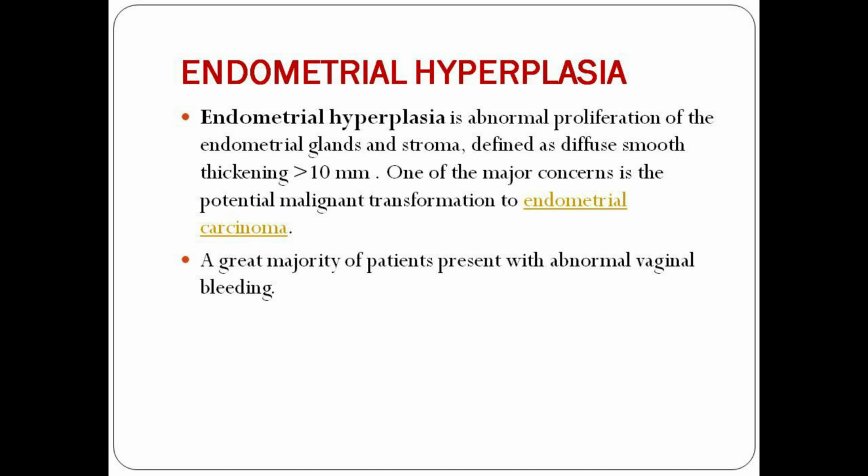A great majority of the patients with endometrial hyperplasia present with abnormal vaginal bleeding, and the same is the symptom in cases of endometrial carcinoma. So the main point is that we should differentiate between endometrial hyperplasia and endometrial carcinoma.